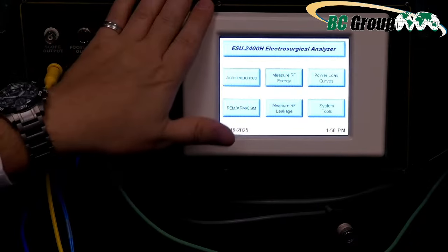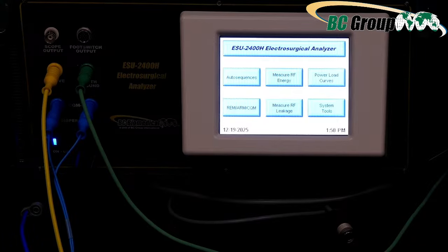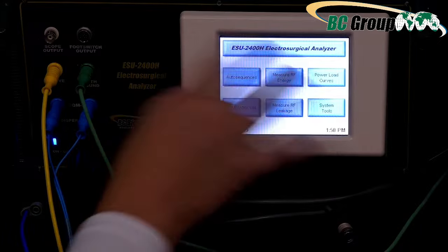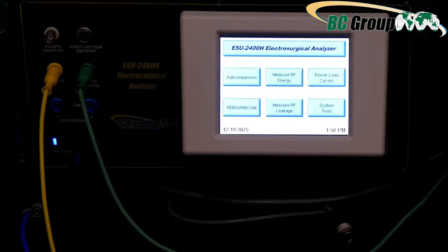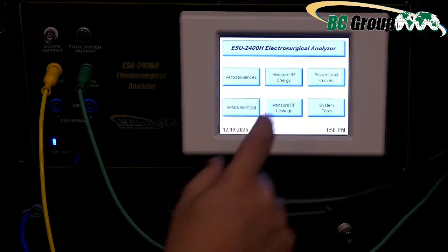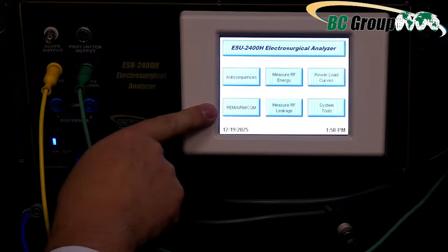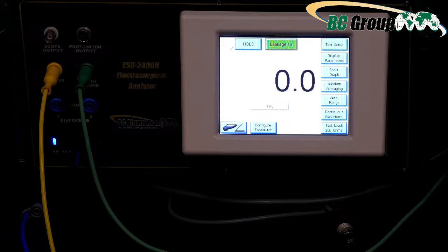But this guy down here has fewer ports for a reason, guys, because it has little switches and stuff inside that do a lot of the telephone operator stuff automatically. Okay, let's go ahead and get rid of this cable, and let's go to measure RF leakage. So we covered REM, ARM, CQM. Now we're going to go to measure RF leakage.